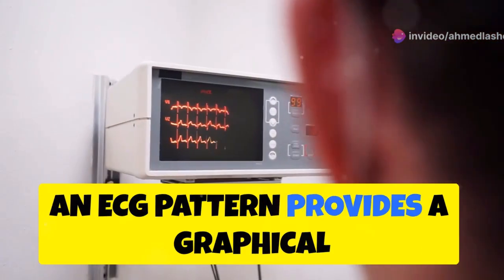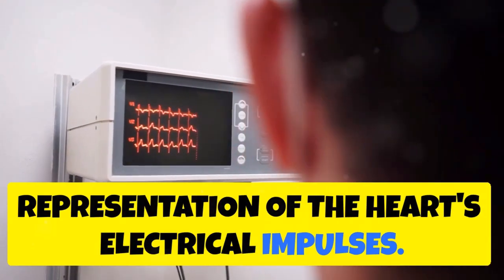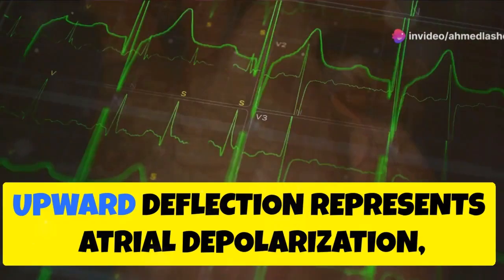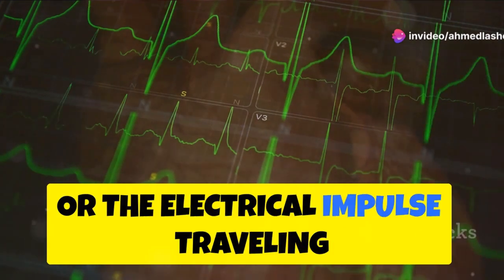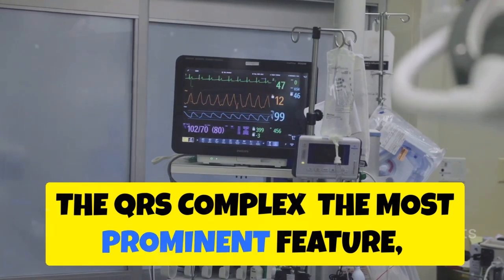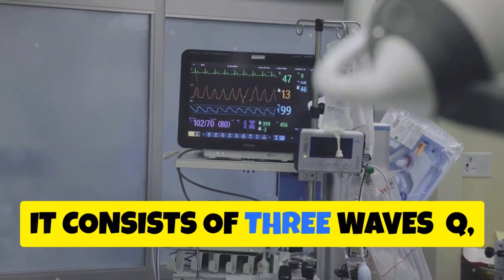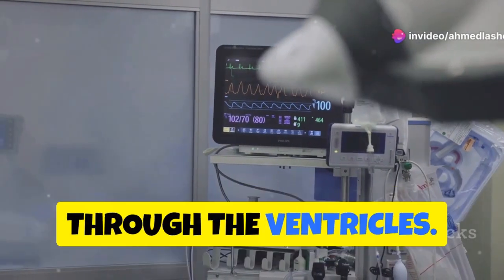An ECG pattern provides a graphical representation of the heart's electrical impulses. Here are the main components. The P wave. This small upward deflection represents atrial depolarization, or the electrical impulse traveling through the atria. The QRS complex, the most prominent feature, indicating ventricular depolarization. It consists of three waves, Q, R, and S, showing the electrical impulse moving through the ventricles.